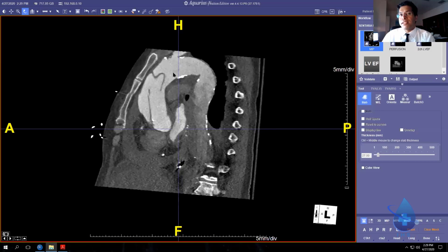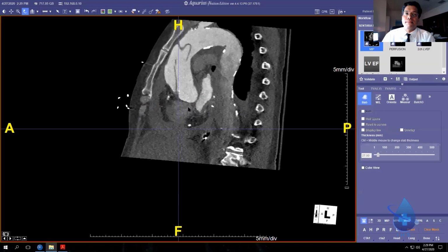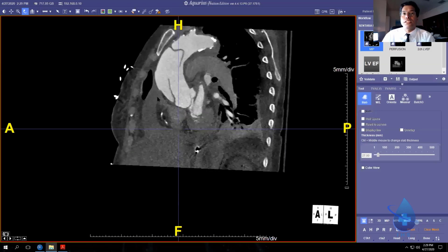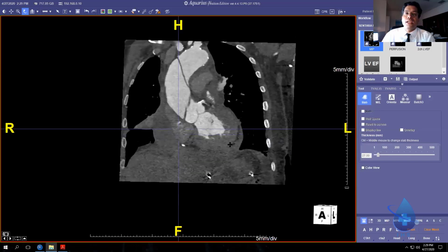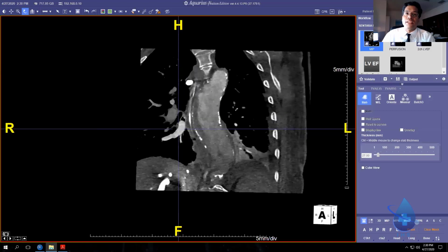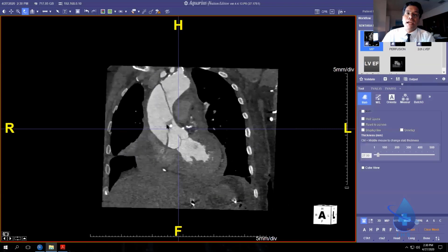And by the time I got to the scanner from the Children's Hospital, she was complaining of blindness because she couldn't see, and I think it's because her cardiac output was just falling off and she wasn't getting enough blood to the brain, and then she VF'd and died. So I didn't have time to do a pericardiocentesis or anything. It was just too late. So this is illustrative of the hepatic vein opacification and SVC reflux contrast into the azygos here from tamponade from a type A dissection.